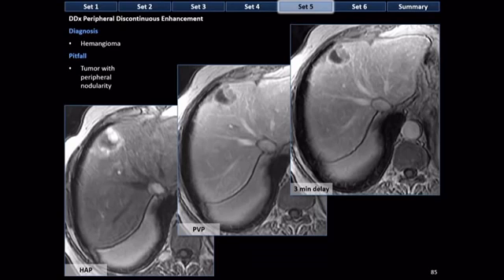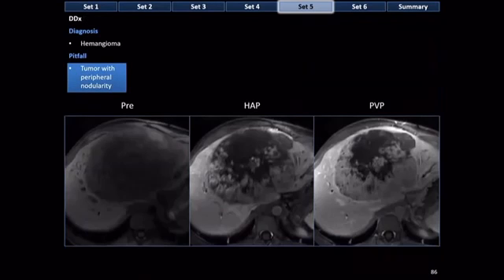Notice, by the way, that what we're probably seeing here to some extent are nodules within nodules and maybe an area of necrosis, which is what's giving this HCC the appearance it has. Now, some of you might be thinking, well, this is a pretty easy case. I wouldn't get that one wrong. But here's a case that a radiologist did get wrong.